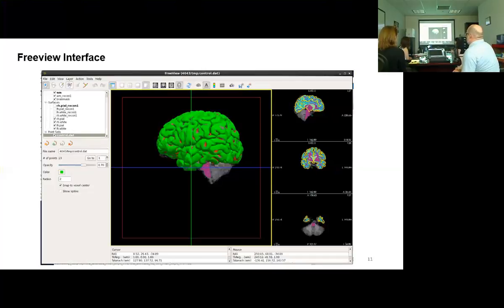Okay. So for you, Bobby, I don't know how deep into the edits you're going to get. You may just want to be assessing, out of the gates, oh, something went terribly wrong here, we've got to figure this out. Or not terribly wrong, but something not right. Basically assessing whether we have to do something manually before we can move on to analysis. If so, this may not be as relevant for you.